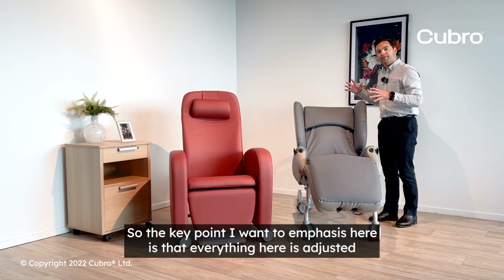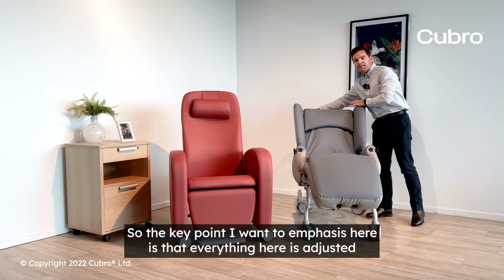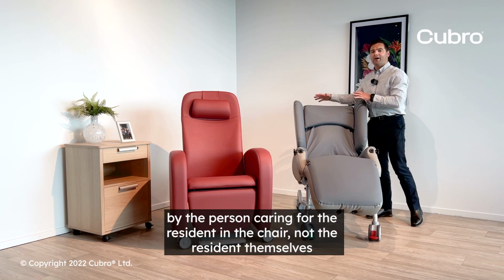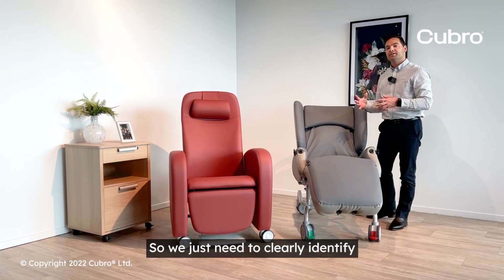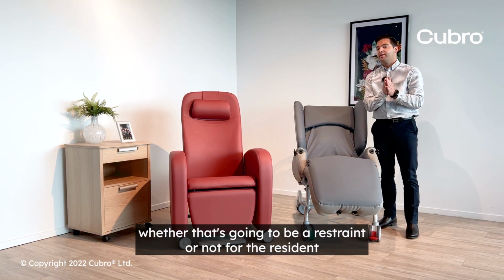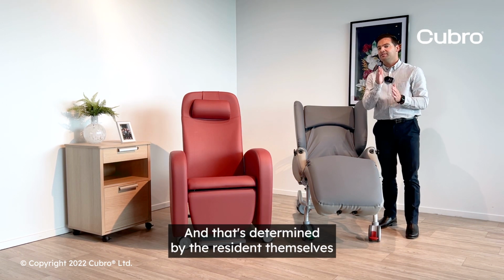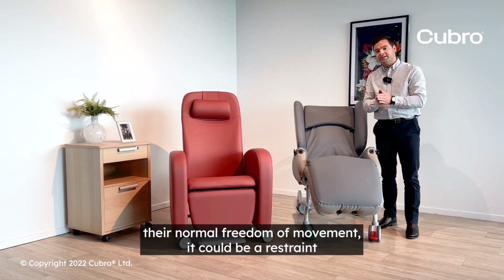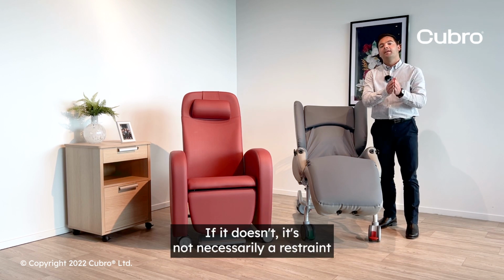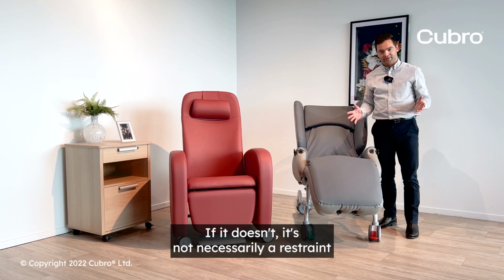So the key point I want to emphasise here is that everything here is adjusted by the person caring for the resident in the chair, not the resident themselves. So we just need to clearly identify whether that's going to be a restraint or not for the resident, and that's determined by the resident themselves. Because if we go back to that same old thing, if it limits their normal freedom of movement, it could be a restraint. If it doesn't, it's not necessarily a restraint.